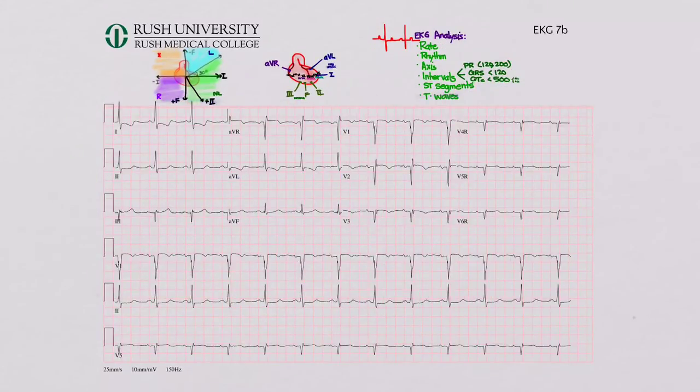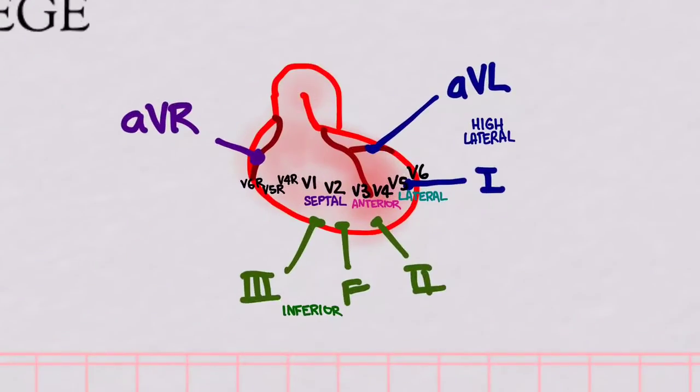So here is that right-sided EKG. Now one thing that I want to note is I made these say R. An EKG machine, when you print it, will not print the letter R here. So you got to write those in by hand. And so what basically we did here was add a couple of new leads on here. And so I had to cram them in here so that they look like they're all crunched in. But V4R, V5R, V6R, which you look at this side, look at the right side of the heart now.